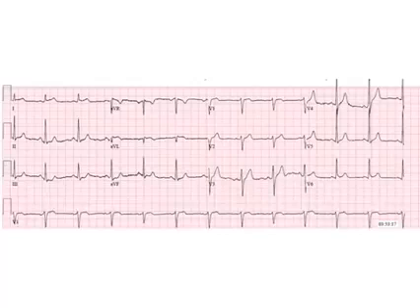So this is a normal electrocardiogram, and I think it's really worthwhile to stare at some normal ECGs before we talk about the abnormal ECGs, because if you don't know what normal looks like, how the hell are you going to know what abnormal looks like? So really take this in.